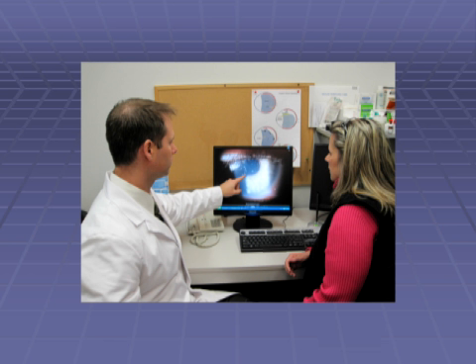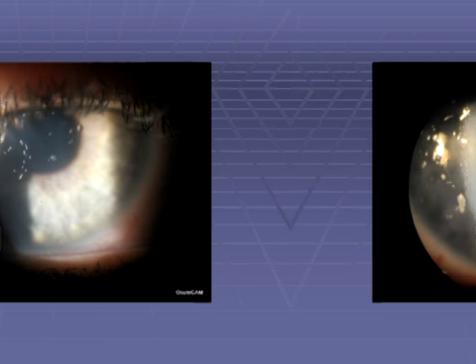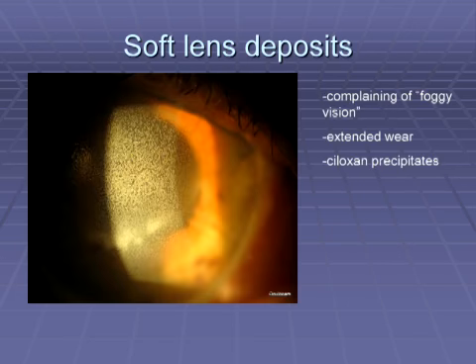While I have found the OculoCAM system most beneficial for complicated cases, there are several other useful applications in standard lens fittings and in patient education as well. Photographs of contact lens deposits serve as excellent reinforcement for cleaning and replacement programs. In the first slide, the patient was wearing her lenses overnight while using antibiotic ointment for blepharitis treatment. These were actually crystalline precipitates from the ointment.